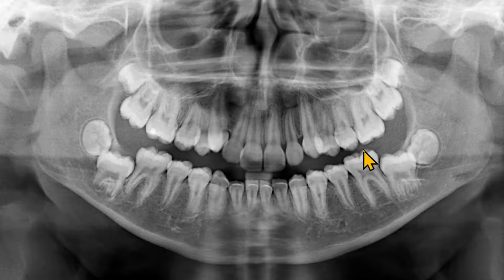In this image, the hard palate is almost straight, but we can see the occlusal plane has a prominent smile. So with the chin being down, the roots of the mandibular anterior teeth are out of the focal trough. Therefore, the apical areas of anterior teeth are not properly seen. If we have any disease here, we may have missed that. Again, the posterior borders of the ramus are pointing towards the center of the film.